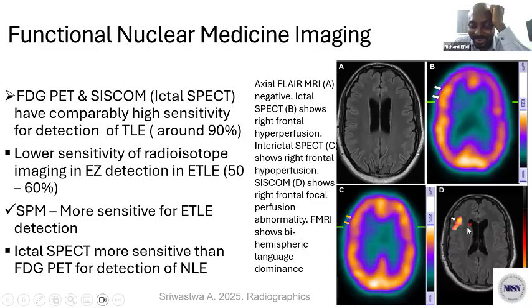This patient had a functional MRI that shows the involvement of the eloquent area by this lesion. For that reason, the patient could not proceed for surgery because surgery will result in disastrous consequences. Rather, the patient had neuromodulation, which is an alternative treatment in this kind of case.